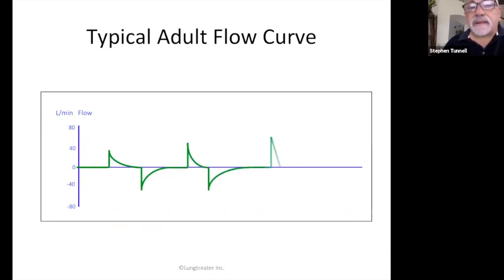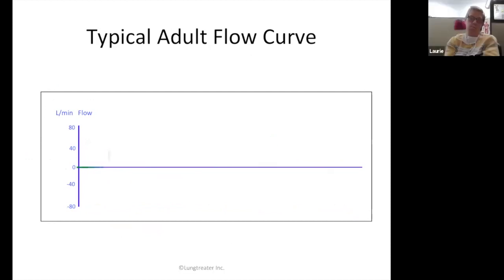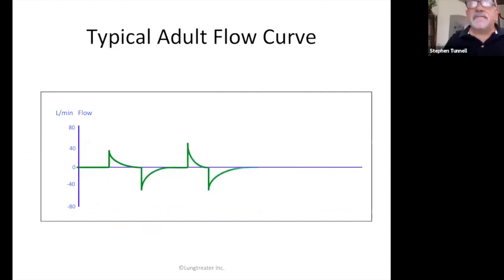We are also very interested in the flow that's going in, because flow over time is volume. There was a question about tidal volume. This area under the curve is the tidal volume that we're giving to the patient. It's the amount of flow. Think of it as watering. I like to use the analogy of watering your lawn or your plants. The higher you turn up the faucet, the more flow comes out of your hose.